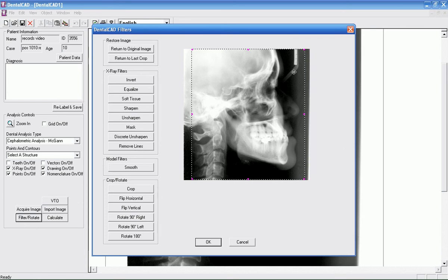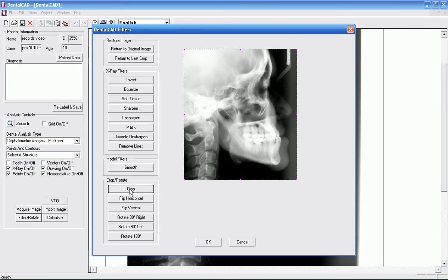As I said, I'd like to leave that, and I'd like to leave this. Normally I would crop it all the way down to here probably, but here I am using the middle one for you. But, you know, down in Nasion, but I would like to use this little ruler just as an exercise for you. Then I click crop.